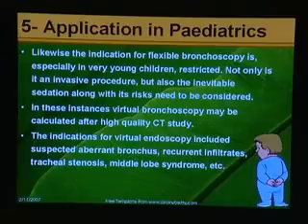Likewise, the indications of flexible bronchoscopy, especially in young children, are restricted not only because of the invasive procedure but also because of the inevitable sedation with its risk factors. In these instances, virtual bronchoscopy can be calculated with a high quality CT study in children.